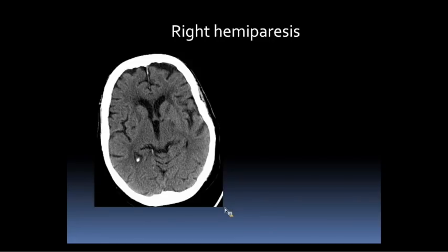So this is going to be a tough one. We see a lot of this patchy hypodensity within the white matter. We kind of see that in everyone. That's just kind of an aging brain. This is pretty dark here. This is probably a chronic lacunar infarct. This stuff is just the chronic white matter changes. And the abnormality is right here, actually.